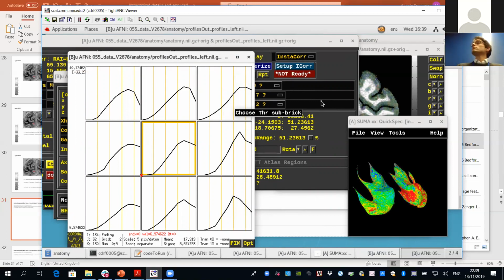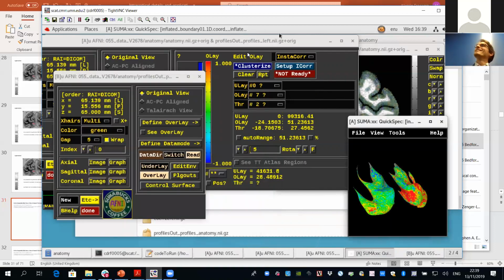Cool. Okay, so shall we have a look at the MP2RAGE that we acquired today? It's going to be less than 5 minutes, because if it works, we see it. No, this one was another acquisition, data we acquired in Utrecht a few years ago. This is MP-RAGE.